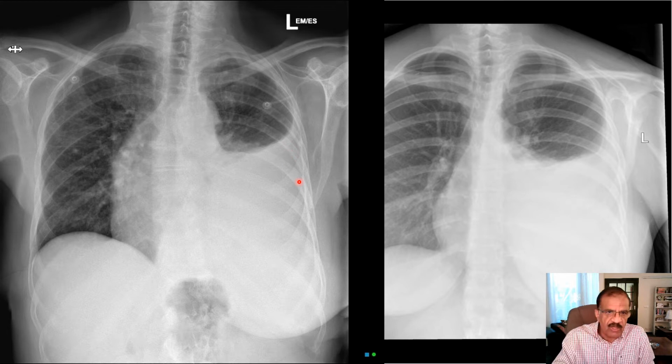Now please note down one thing. If you trace the trachea, the upper part of the trachea is normal, but you can see the carina is somewhat pushed to the right side, and the right bronchus and left bronchus. I'm not sure if you can appreciate this, but it is quite obvious to me on this computer screen that this is shift of lower part of the tracheal structure onto the opposite side. And if you see right cardiac border, this is also displaced to the right. So this big pleural effusion has pushed heart and the lower part of the airways to the right side, further confirming that this is something which takes up the space.